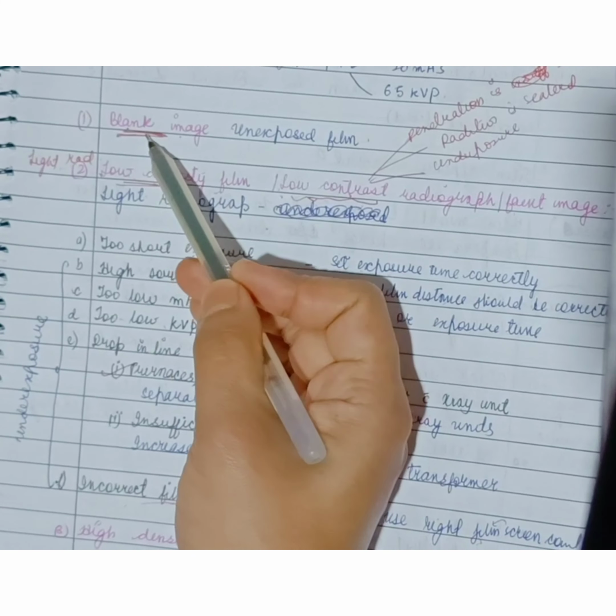Studying about the radiographic faults, we already studied about the projection errors and exposure errors. Now we'll be studying about the processing errors. Beginning with the processing errors, first one is the reticulation or orange peel appearance. Now this is a rare error. Okay, this occurs commonly in areas with extreme climatic conditions. Okay, so in this the film appears cracked because of sudden temperature change during processing.